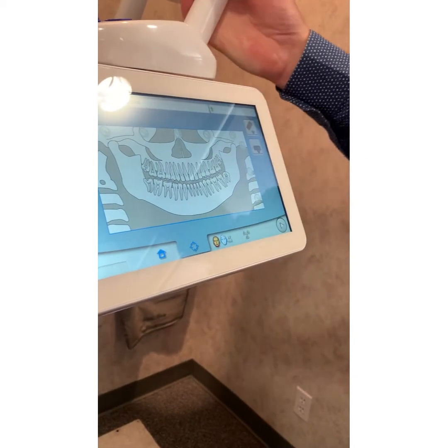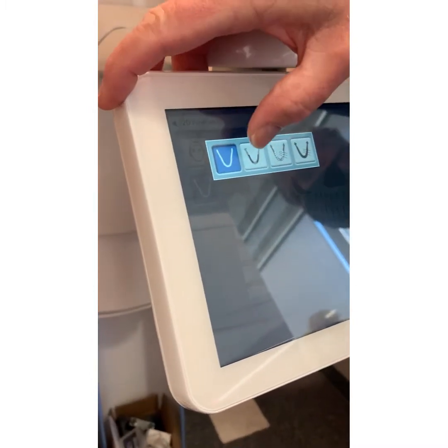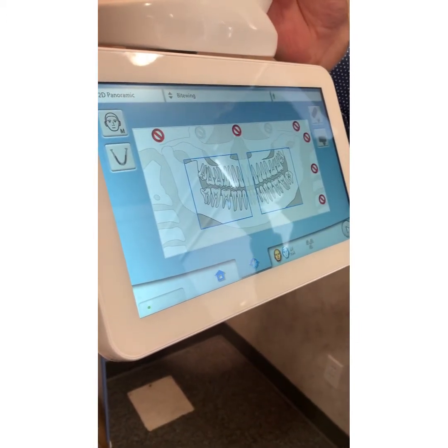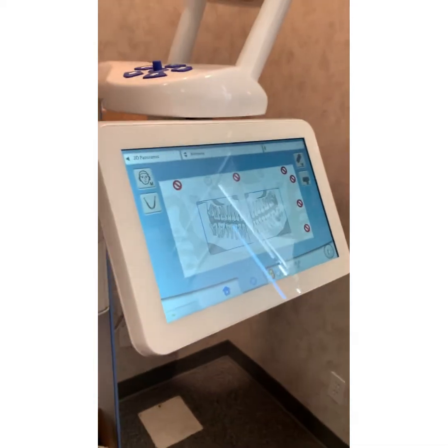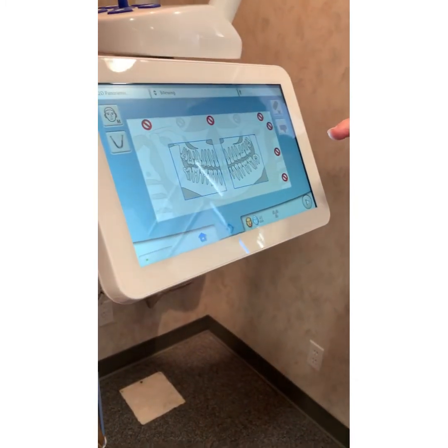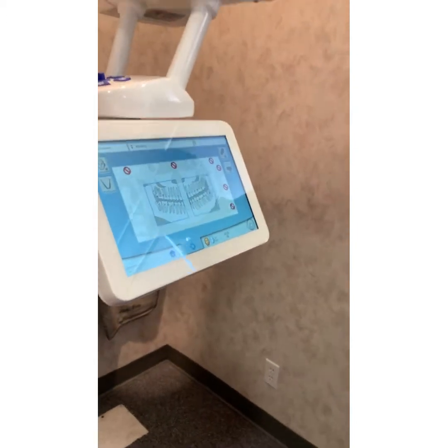I'm kind of looking over your shoulder. This feature right here is where all your 2D projections are. It's either here or here; either way it gets you the same. The second one is your bite wing right here. As we discussed before, if I set the proper expectations, this is a great tool when you have a shallow palate or tori, or a small oral cavity where you can't get a sensor in, or they're a gagger. You can get close with an explorer and they start gagging. Then you're going to get some information you wouldn't otherwise be able to get. But there are some anatomy limitations with a fixed tube head: you're going to get some really good bite wings and some that you don't like so much.